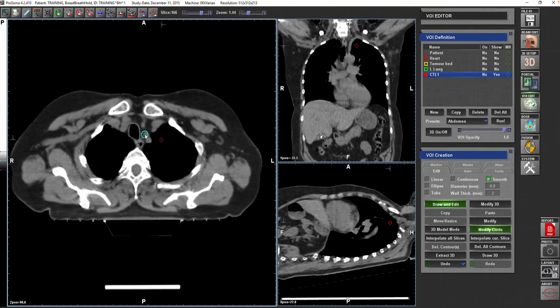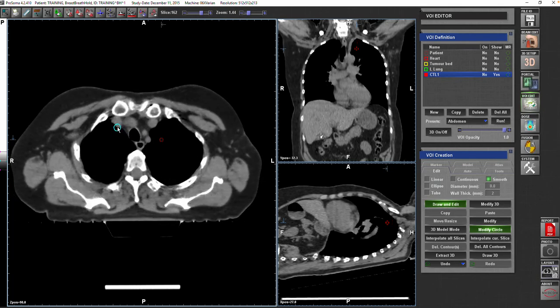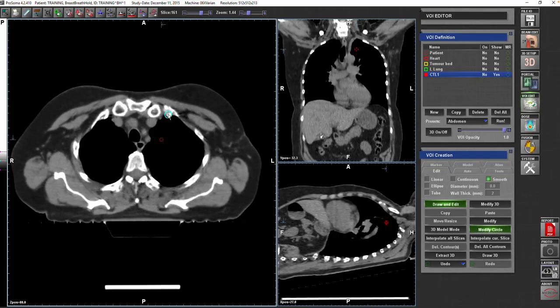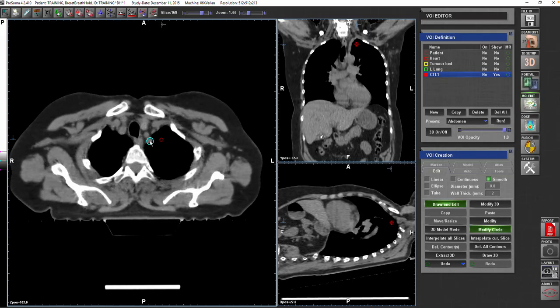And also, it's very important that the subclavian artery on the right side is not at the same level as on the left side. We just talked about the origin of the subclavian.